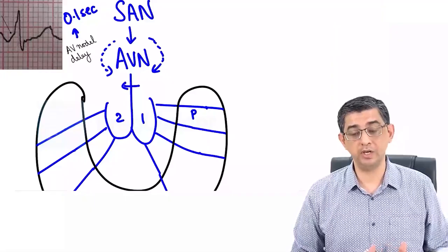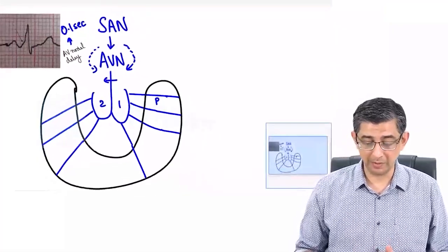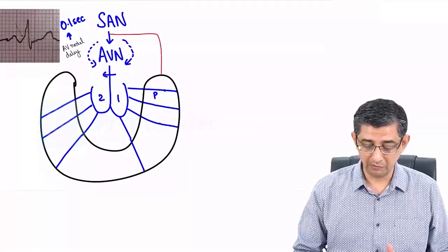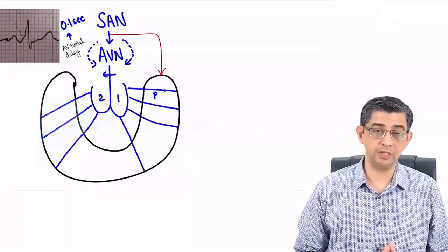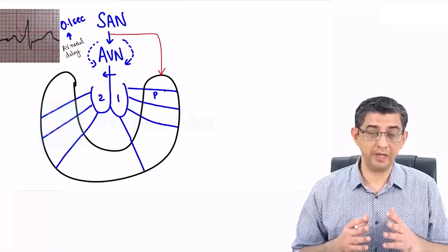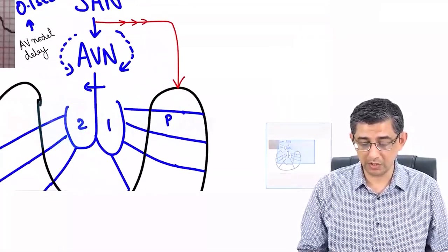And the repolarization current will be flowing from outside to inside and is responsible for the T wave. Now the problem in this particular patient that I'm going to show before you is an accessory bypass pathway. The way I've shown the red fiber, I want to highlight that it is bypassing the AV node. Remember, AV node is like a broken Indian road, and the red fiber that I've shown before you is like an express highway.